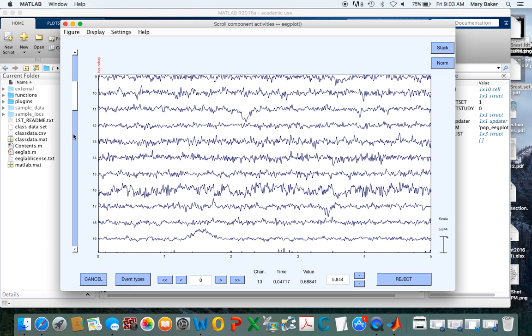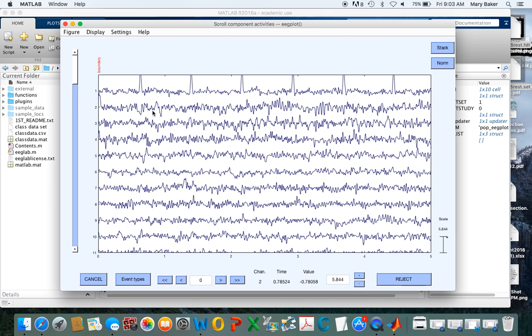So we kind of did some manual pre-processing there. In some of these channels toward the top, you can see the amplitudes are bigger. You can see just the characteristic of the signal looks a little bit different. This one has got something that seems to be a little bit correlated with this heartbeat, so you can see they don't look completely independent.